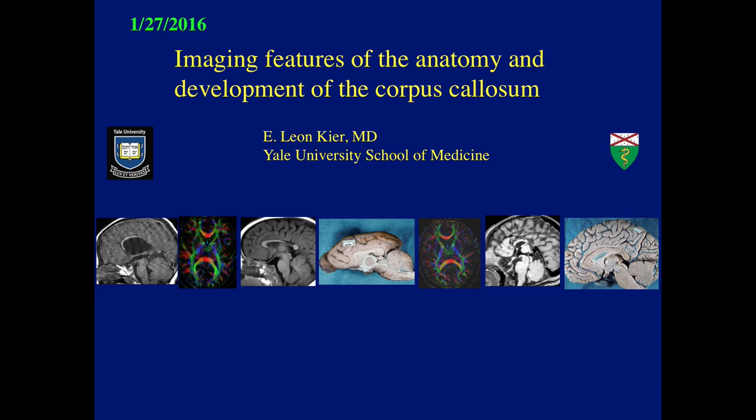I will not be discussing the usual board review type lesions of the corpus callosum. I will focus on some less commonly discussed features of the corpus callosum that we should be aware of in our daily practice, and also be discussing some developmental issues of the corpus callosum.